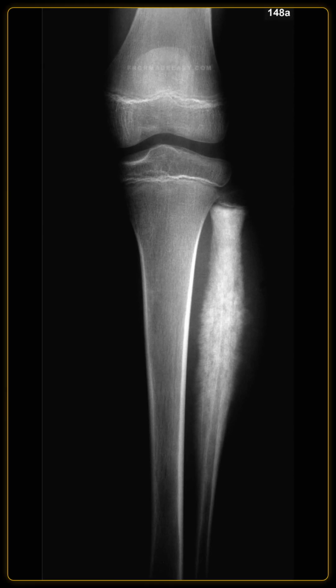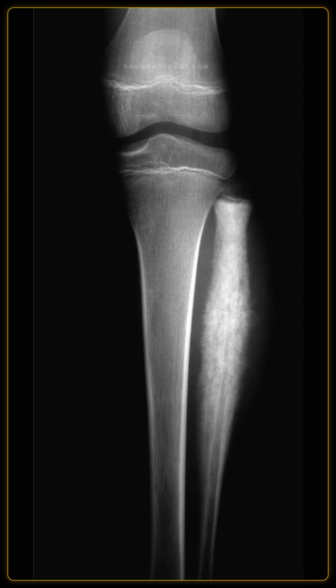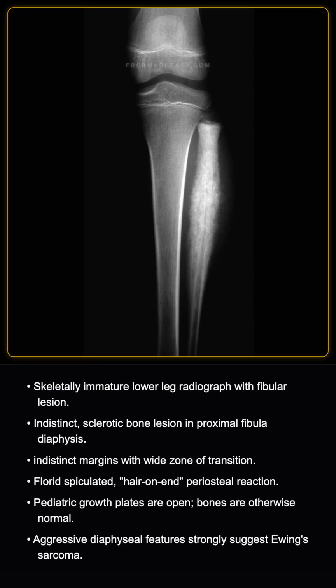A 10-year-old child presents with leg pain and fever. I am showing you the radiograph of the lower leg. Describe the findings. All right, let's take a look.